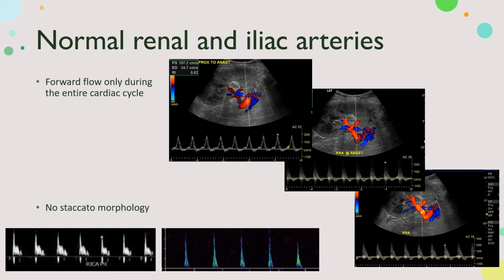The second image has such a narrow systolic peak, you don't know what the heck's going on. And you can see a little bit of a blip below the baseline. So there is a touch of reversal flow. This is abnormal. This is probably a kidney that's already failed.